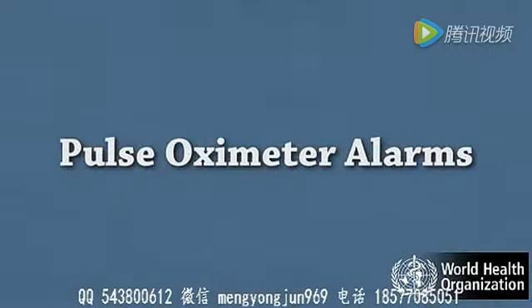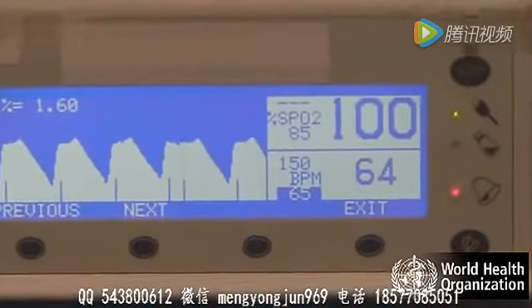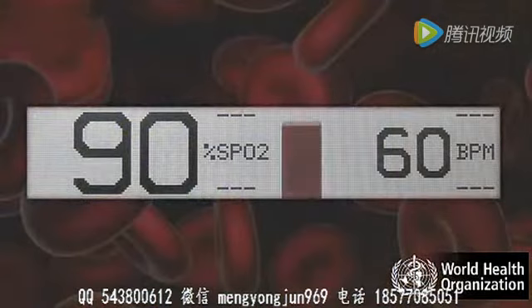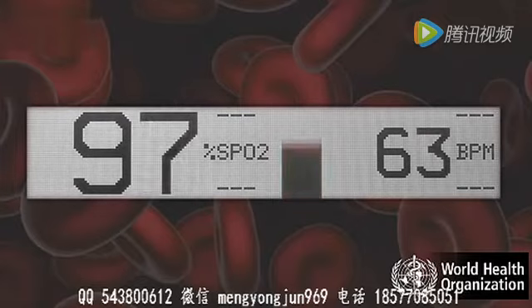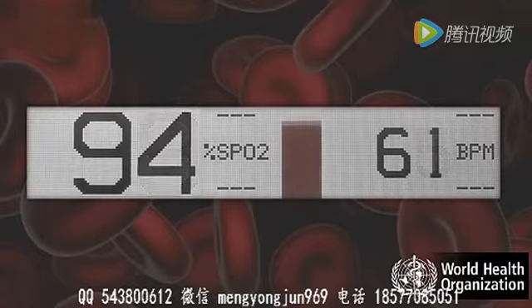Pulse oximeter alarms. Alarms alert the anesthesia provider to clinical problems. There are 4 possible alarms. Low saturation emergency warns of SpO2 at or below 90%, indicating hypoxia. In healthy patients under anesthesia, the SpO2 should be 95% or above.